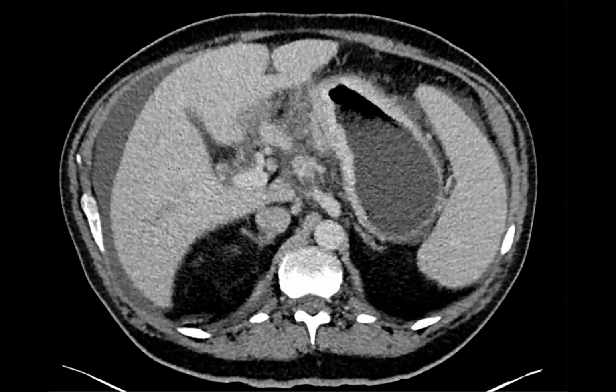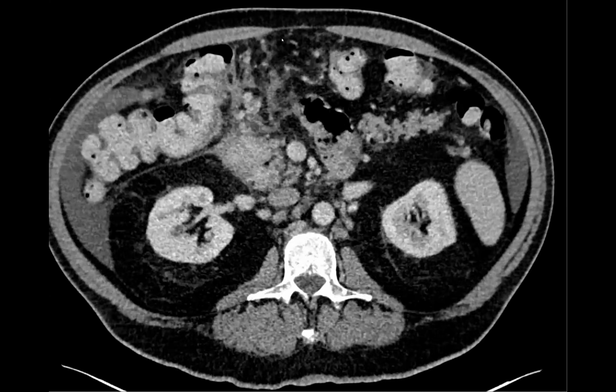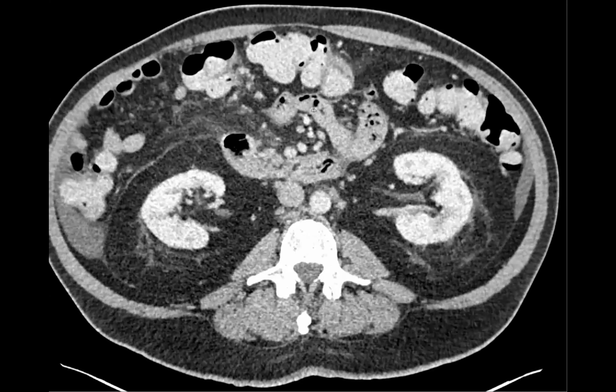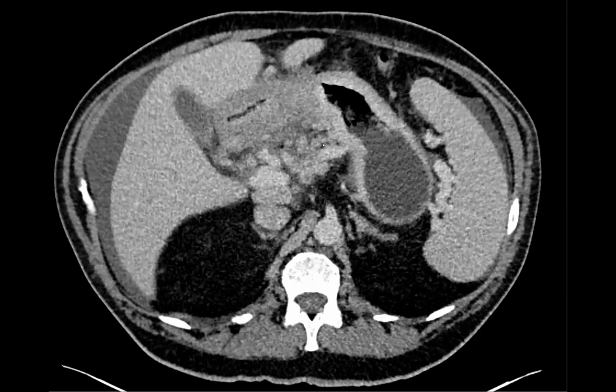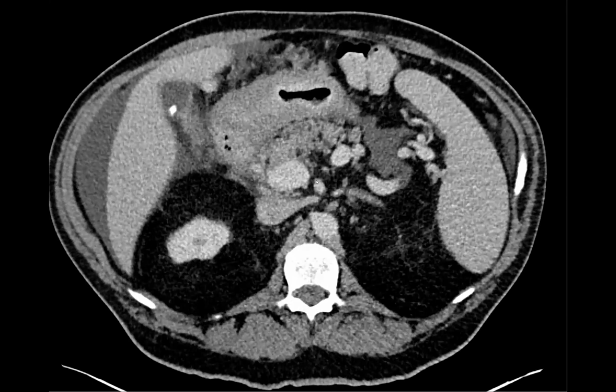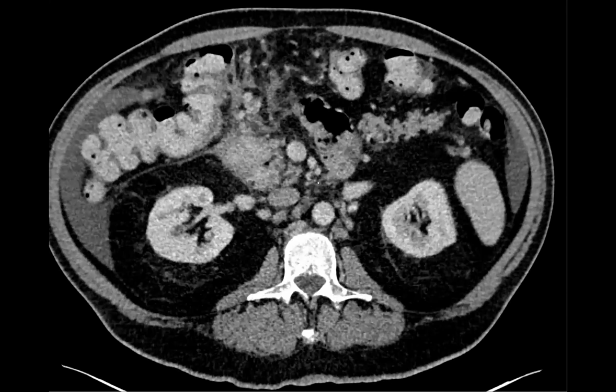When they do surgery, I mean, in this case, there probably is more nodularity extending outwards. When they do these gastric cancer surgeries, they do what's called a D2 lymphadenectomy, where they resect all of the nodal stations. I think there's more than 20 of them surrounding the stomach. There are several different areas with different levels of N1, N2, N3. But one important thing is that all of the stuff around the stomach is local disease. Around some of the vessels, like the SMA, celiac axis is a little bit further.